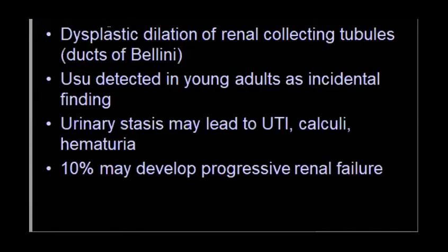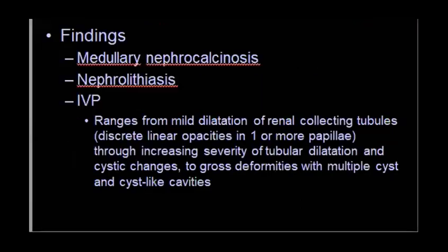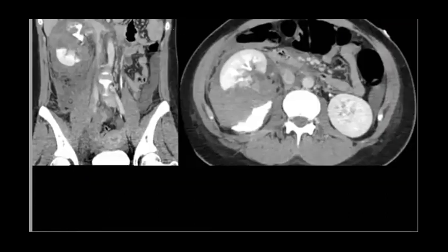Again, another appearance of medullary sponge kidney. Okay? Medullary sponge kidney. What happened here?